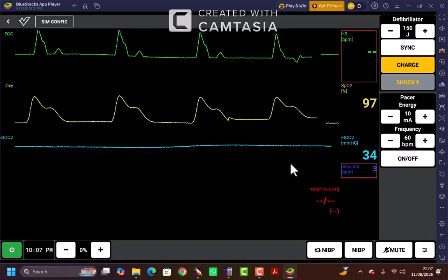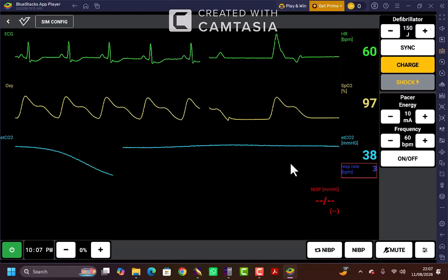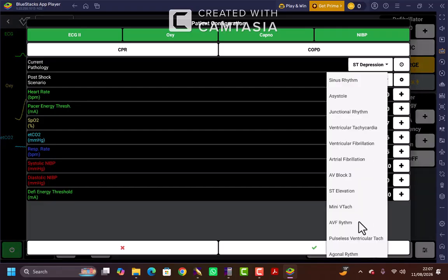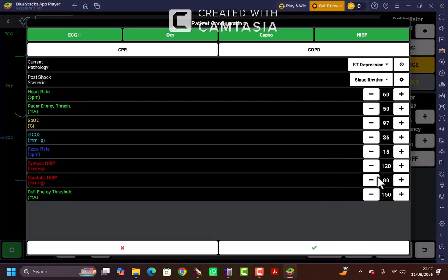And the zoom is available as well for us. Instead of changing manually within the slower method, it changes in less than 1 second. Next, onwards, test those rhythms as well.